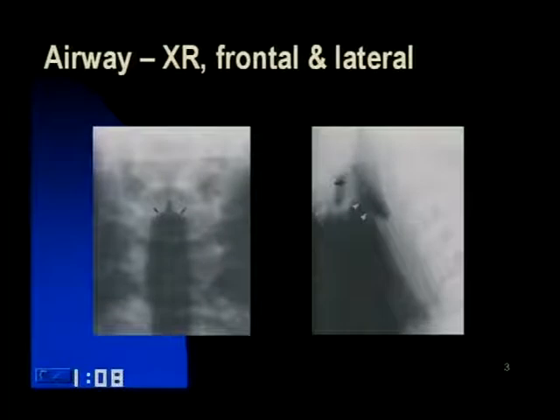Radiologic imaging techniques obtain two films, generally known as soft tissue neck, and use high KV and filters to reduce the prominence of bony structures and accentuate soft tissue detail. The AP film is taken during inspiration and phonation. It shows closed vocal cords and the immediate subglottic area. The arrows show the normal subglottic shoulders.